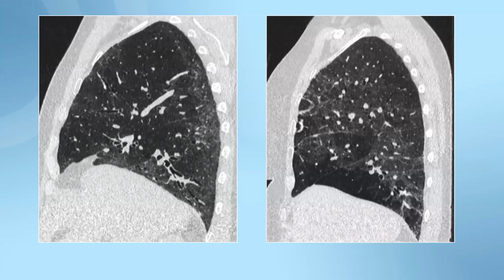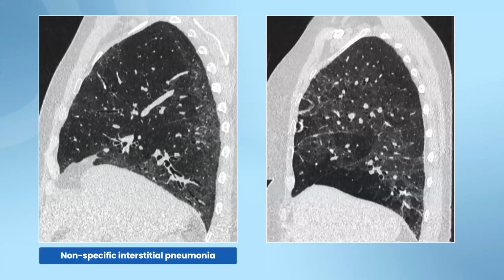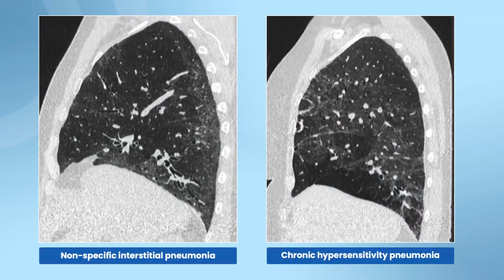Distribution, yes, exactly. I get completely right answers here. The distribution makes a difference. And that's how our differential diagnosis works in radiology. We look at the patterns to get an impression that this could be fibrosis. Whenever we get this impression by seeing reticulation or ground glass, we look for signs of fibrosis, meaning loss of volume, traction bronchiectasis, and honeycombing. And then we look at the distribution to run our differential diagnosis. That's the whole thing about differential diagnosis in CT. It's always the same: pattern, signs of fibrosis, distribution.